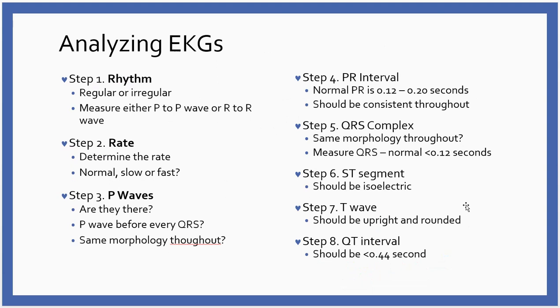So if you're going to analyze an EKG, when you get some practice with EKGs, you get to the point where you can look at them and you know, oh, okay, that's a sinus rhythm, or that's atrial fibrillation, or that's VTAC, or whatever it is. And so, you do some measurements and things like that.